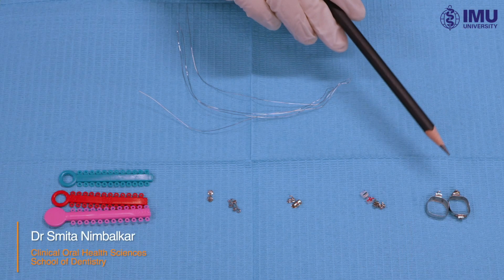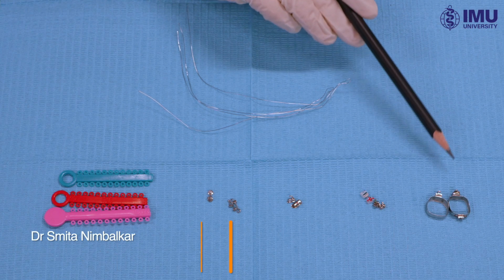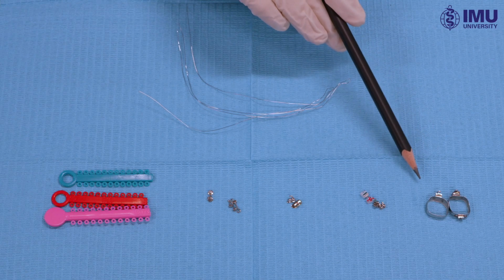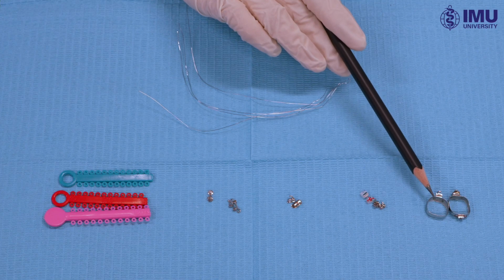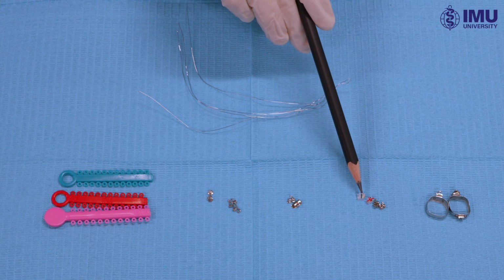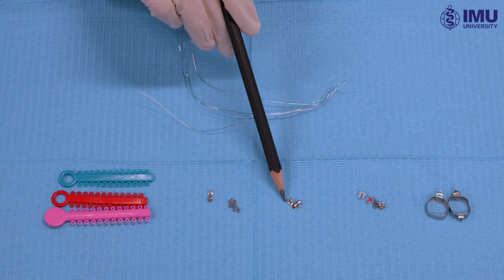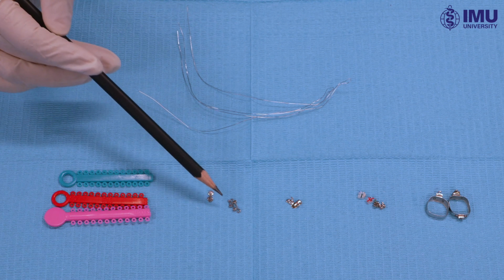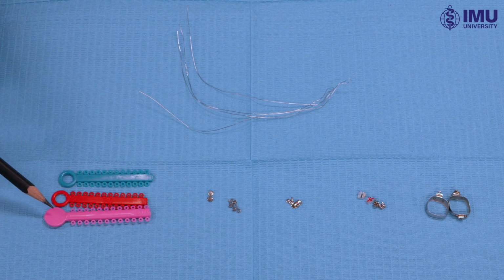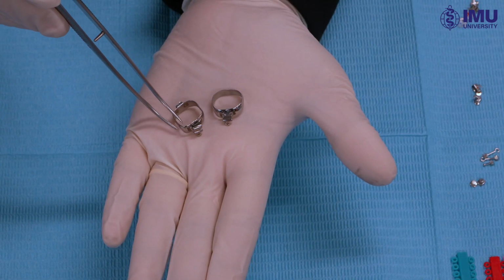Let's start with the passive components of fixed orthodontic appliances. Passive components are the components which are bonded onto the tooth or banded and which don't carry out any orthodontic tooth movement on their own. For example, molar bands which are cemented onto the tooth, brackets which are bonded directly onto the tooth, molar tubes, here they are bondable molar tubes, lingual attachments such as lingual buttons and some crimpable hooks, elastomeric modules and ligature wire. Let's check about molar bands.